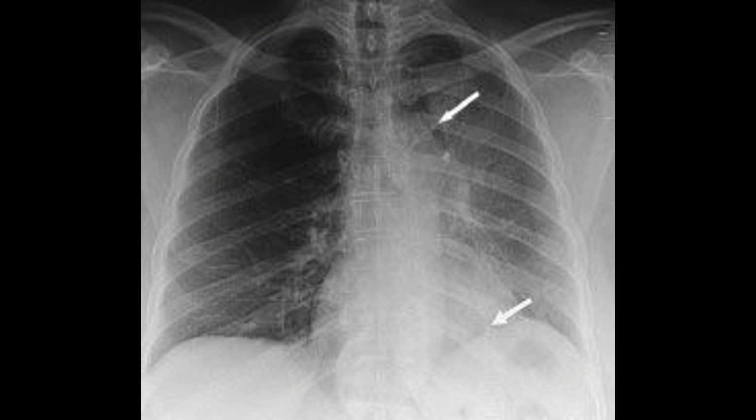There is also increased lucency around the aortic arch, known as the Luftsichel sign, which represents interposed hyperexpanded left lower lobe between the collapsed upper lobe and the aortic arch.